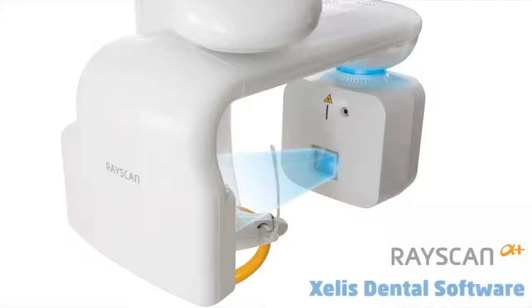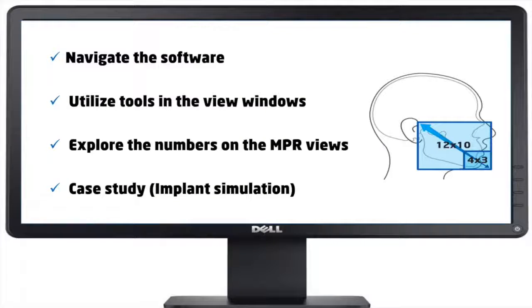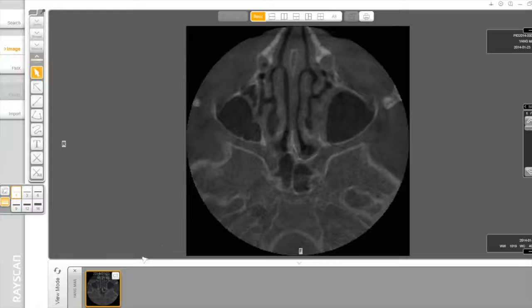Introducing Xelis Dental Software. This video is designed for new employees, self-paced training, and provides how to manipulate the 3D viewer scanned from RayScan Alpha Plus. By the end of this video, you should be able to navigate the software, utilize tools in the view windows, explore the numbers on the MPR views.